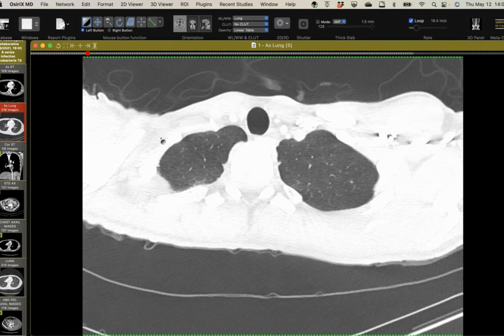But this is one of the cases. I've not seen this much soft tissue involvement with TB before, so I thought it was a nice case. And the lung findings would be very helpful in making that diagnosis. Blastomycosis could also do that, but it tends not to form so many abscess pockets, but rather more inflammatory pockets and osteomyelitis. And it can also give you miliary disease.